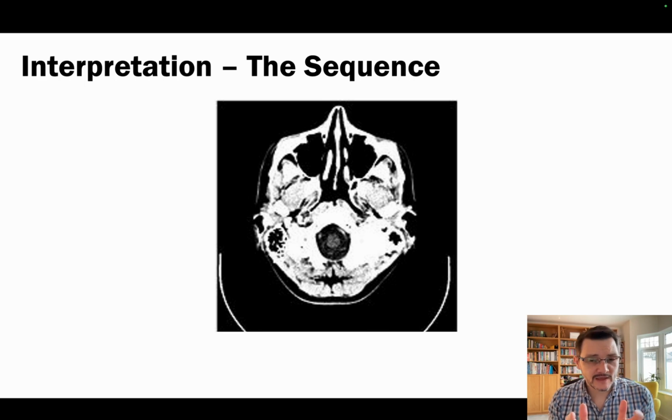I've tried to simulate as best I can with a PowerPoint, so if it doesn't quite work, please accept my apologies. These are widely available CT images online. They aren't patients, but they are anonymized. So this isn't somebody you should know, and the permission was given for those images to be displayed on the internet free of charge. So first things first, to orientate yourself.